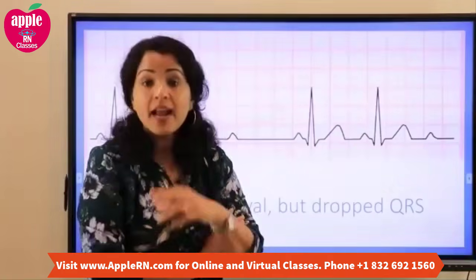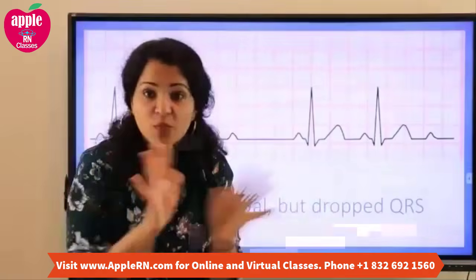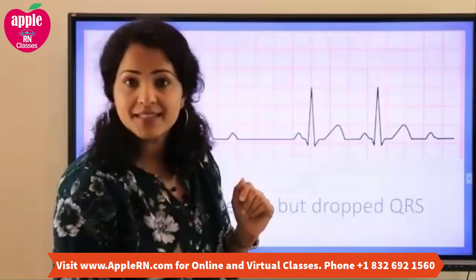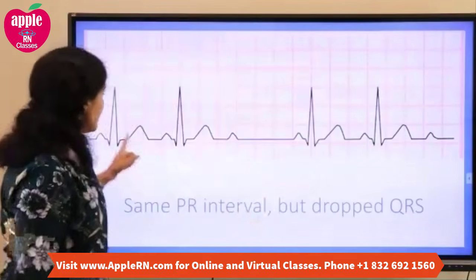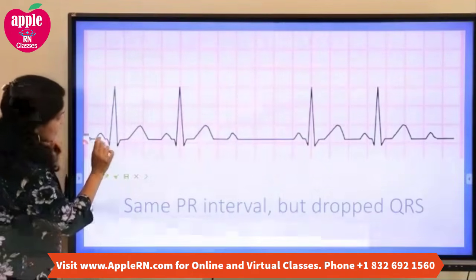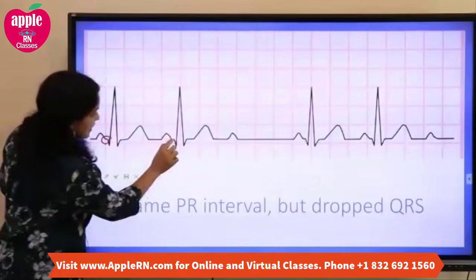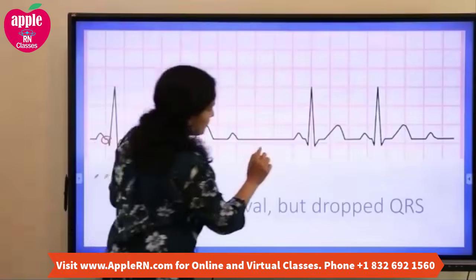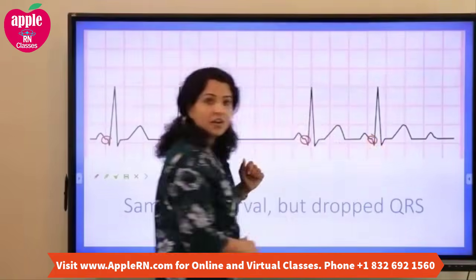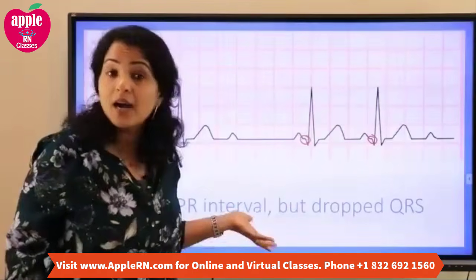But here in second degree type 2, there is no sign. There is no PR interval getting longer. PR interval is correct, but he just didn't come the next day. That's it. Okay. So if you look at the PR interval, I mean, it's not really easy to see, but still there is a PR interval here, there's a PR interval here, there's a PR interval here. If you look at the PR interval, it's all normal. It's good. He comes at the right time.